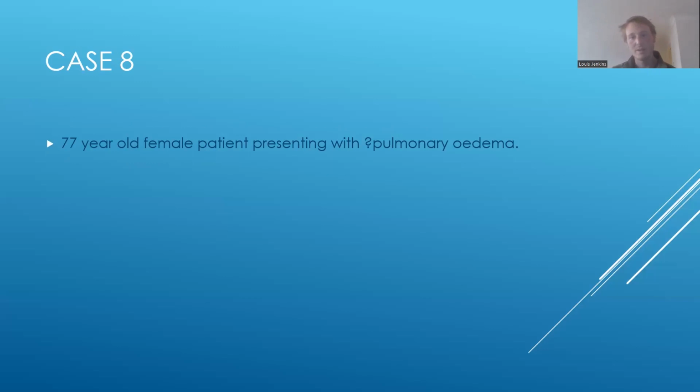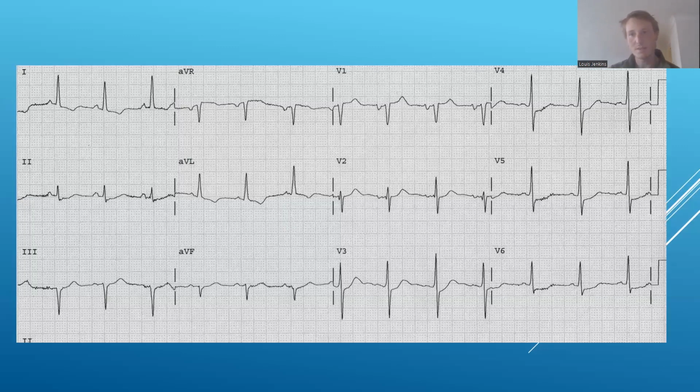We should know what pulmonary edema looks like. I'm sure you've all seen lots of examples of it out on the road. It's pretty common. Here's her ECG. Of note, this patient didn't have chest pain. Just bear that in mind with our interpretation. Now, take a second to pause the video. 3, 2, 1, and go.